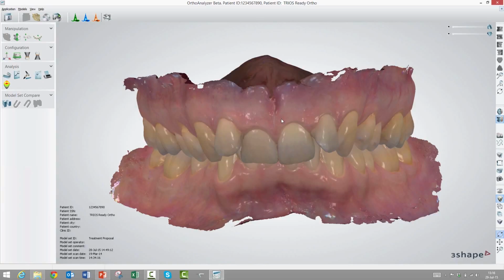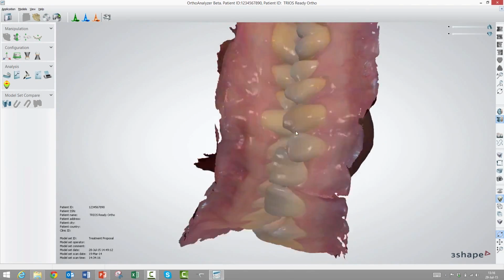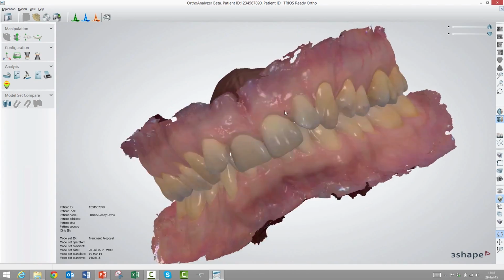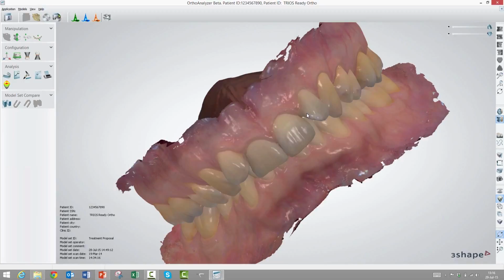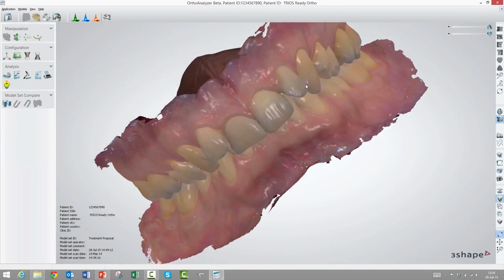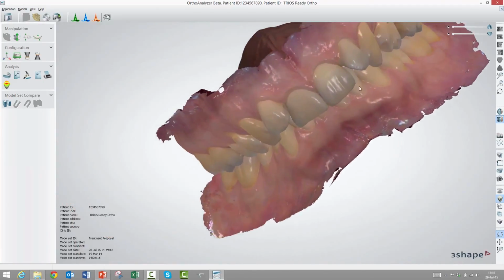The right button, when you move that around, will actually rotate the model on your screen as I have here. I'll just do a bit of wiggling around here, and as you can see, I can move it around in pretty much any direction I want. If you have a middle button and you hold that down, you will be able to move the model in the X and Y direction here, up and down.